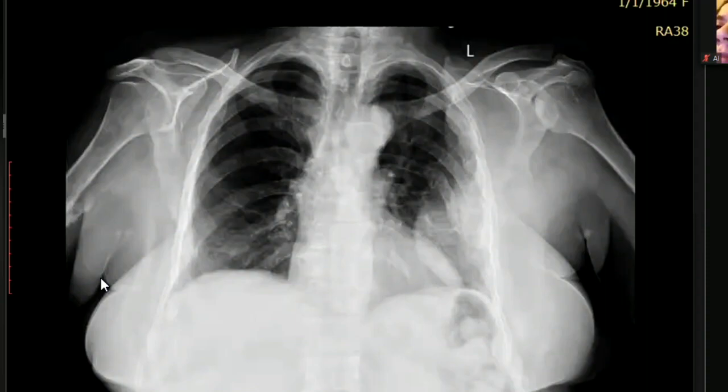What else would you look for? Other than this, I am looking at the bones. Visualized clavicles are normal. As mentioned, the ribs are somewhat irregular in this region, and the humerus, left, I can see the right humerus shows some lytic areas within it, some permeative abnormality.